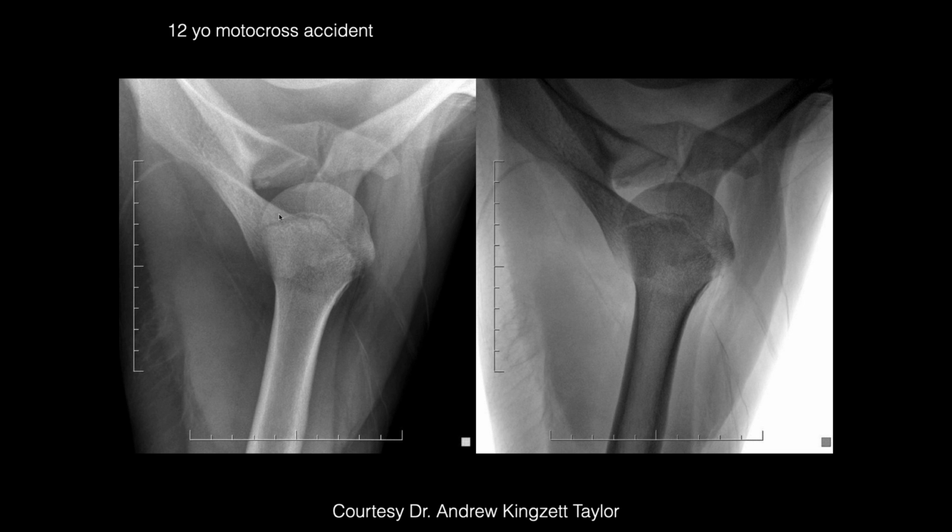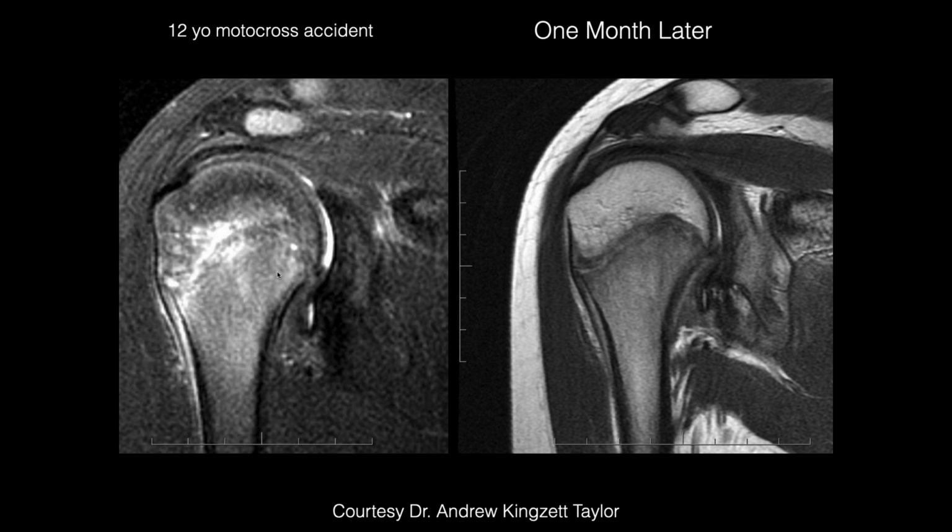The glenoid there doesn't look too bad. What do you mean too bad? It's a 12-year-old. Yeah, I guess that's true. It is irregular for a 12-year-old. And there's some remodeling there of that inferior glenoid as well. And then obviously some marrow edema at the physeal plate, but that could be normal in this age group.